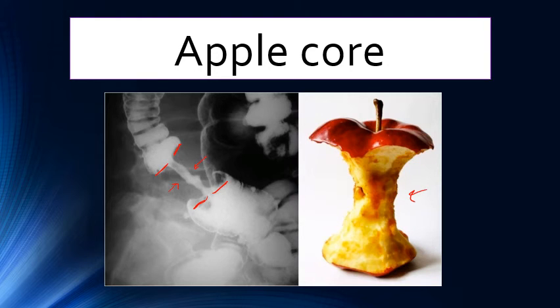But actually, the malignant lesion here, or the soft tissue lesion, is what I'm drawing here. I will draw it with another color. Okay, as we see here, this is the mass. Actually, this is the annular mass. This annular mass forms the lumen in between to be strictured, forming here the shoulder, another shoulder, another shoulder, and another shoulder here.